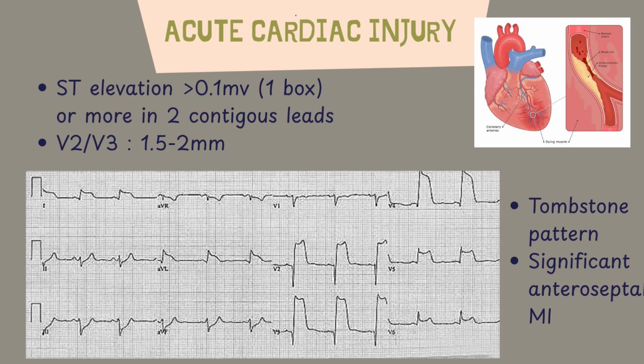And sometimes the ST segment doesn't just rise, it bulges. It forms a smooth, rounded shape that merges with the T waves. This is called tombstone ST elevation, and it looks just like what it sounds like, a tombstone. It's broad, it's convex upward, and it's ominous. This pattern is often seen with massive anterior STEMIs, especially with LAD occlusion, and it's a sign that the heart muscle is actively dying. These are the patients who need to be rushed to the cath lab. There's no time to waste, like now, like yesterday.